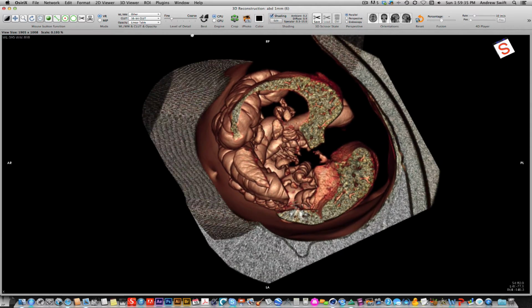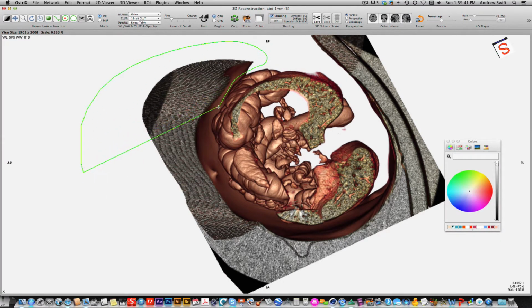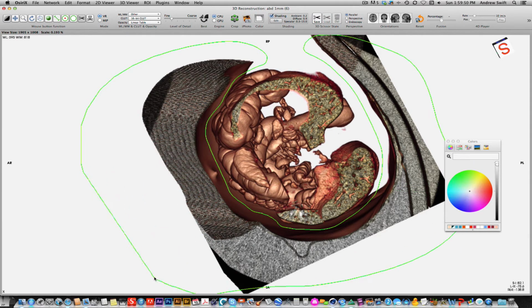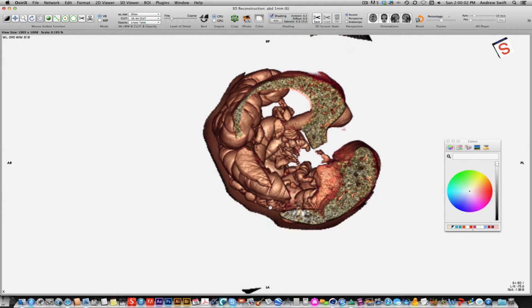And let me change the background to white so we can see this a little better. Scissor tool. The scissor tool is really very, very useful. Use it more and more. It does a lot of what we would do ROIs with. Now, I'm going to hit delete, but if I were to hit return there, it would keep what was inside the selection, this shape around here, and it would delete everything outside of it, okay? And so we might use that in a minute if we can.